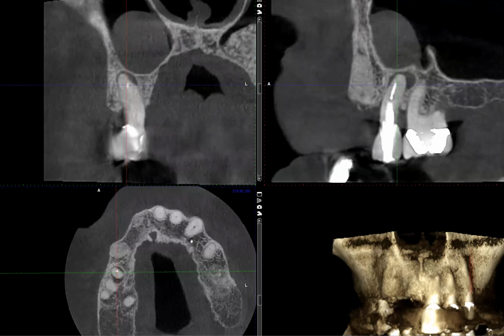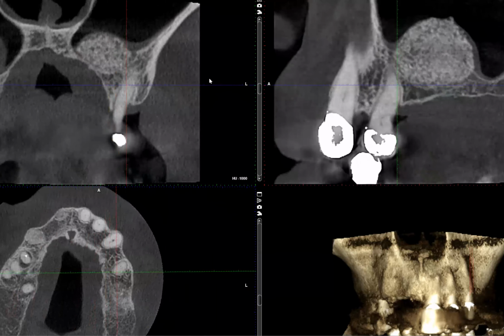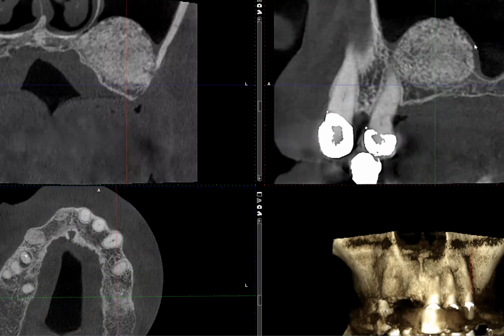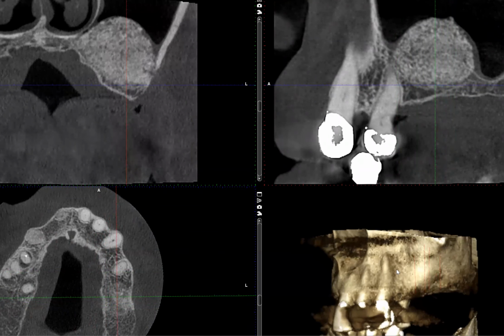But that wasn't the main point that I wanted to discuss, but mostly just wanted to go over how a successful outcome of direct sinus lift would appear on cone CT. So this is excellent, and I'm really happy for the patient and our resident who performed this surgery.